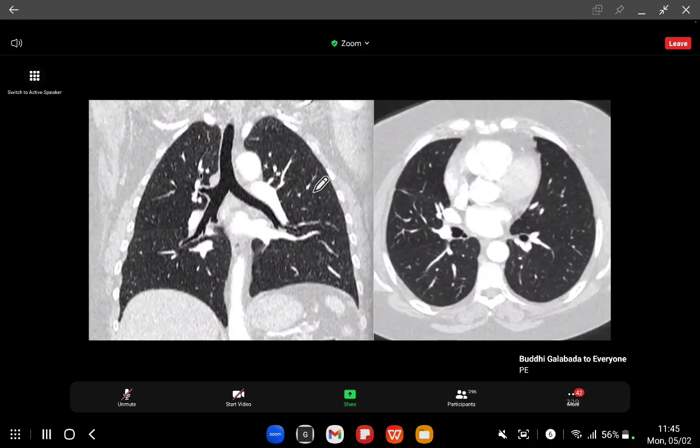Okay, normal variant. Can the college show you normal variants even though it's the 2B? Yes, they can. It's not a pig bronchus, okay? It's not a pig bronchus. So that's the right upper lobe bronchus. There's the bronchus intermedius. What's that bronchus there? It's heading off that way. Yeah, it's the cardiac bronchus. There it is, it's the cardiac bronchus. You don't see them very often, quite rare.